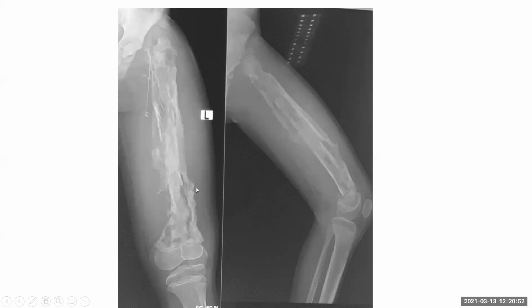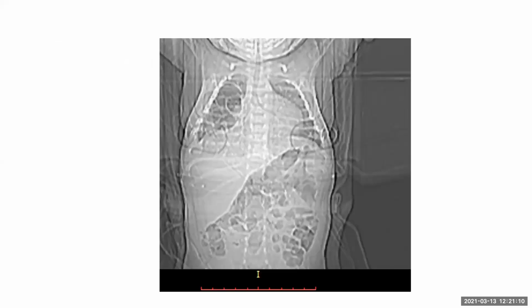So we could do an ultrasound or a CT scan. Ultrasound is a very handy tool in children for any collection of fluid, which we can tell the surgeon to drain. And of course, we will send this patient to the surgeon for debridement of bone and nailing or whatever treatment he wants to give, to save his limb. Understood, madam. So respiratory distress, very rightly said, a CCAM.